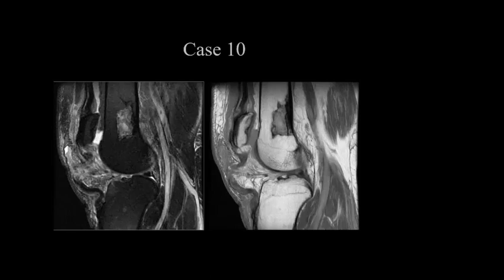Yeah, okay, so your summary is? يعني عندنا الباتيلو tibial tendon rupture وأكو tear بالquadriceps tendon also. Okay, yeah, no, you're absolutely right. There's patellar tendon rupture. Do you know why this patient had patellar tendon rupture?